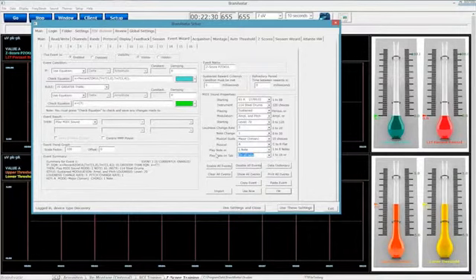And you have to think about what you actually want to use as far as what type of reward sound you're going to get back and what type of instrument you're choosing. For example, steel drums is a very good one that can be sustained and it can be percussive. If you're doing it as percussive, it's going to be hitting the steel drum as it's basically crossing. It's a percussive note. It's not doing much more. A sustained note is going to be as if I'm holding that button down.